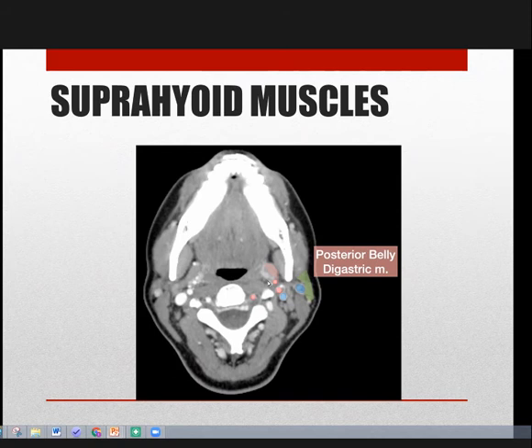Actually, stylohyoid, the last muscle, I haven't got a CT scan imaging depicting that particular muscle because that specific muscle is kind of thin. It blends with the surrounding soft tissue, so it's really hard to discern that on the CT scan imaging. So that ends my report.